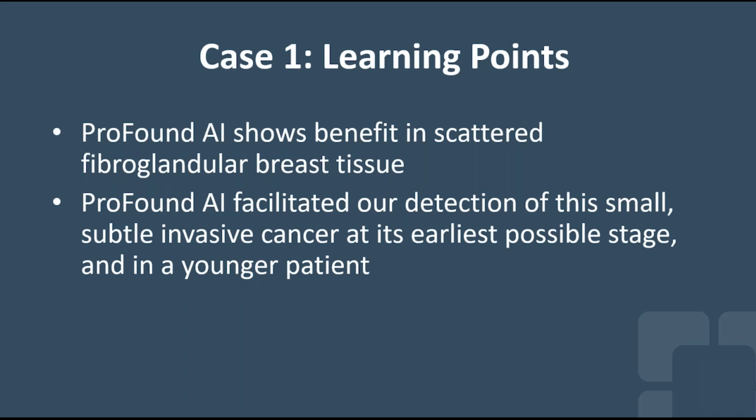So ProFound AI certainly in this case facilitated our detection of this really small invasive breast cancer at, you could argue, pretty much the earliest possible stage and in a young patient. It would be pretty hard to find a cancer smaller than this, with that morphology that we're seeing in this patient.